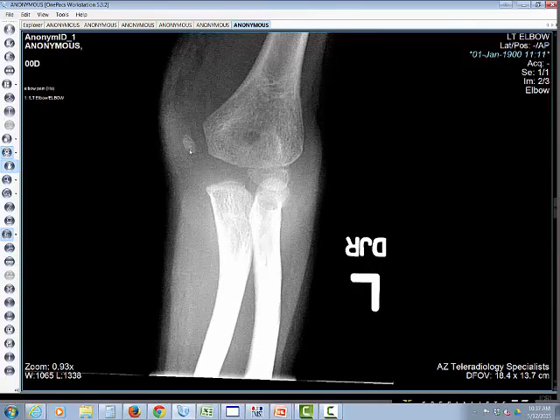But what do we see that's different about this medial epicondyle? It's not tucked in here really close to the humerus the way it should be. So this is definite abnormality. We can even see overlying soft tissue swelling, and this is an avulsion of the medial epicondyle. In a severe case, this bone can be avulsed and pulled down by the tendon and may even project in this region, which could be confusing. It could be mistaken for an ossification center at the trochlea.